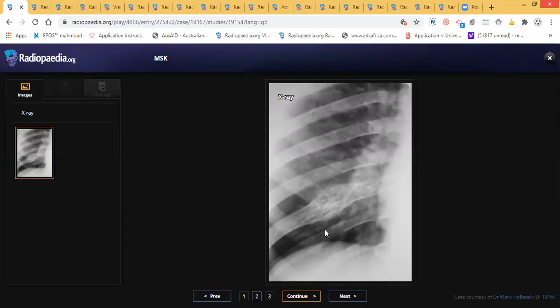Again, if you shift to this case, you will mention what we mentioned now. It could be fibrous dysplasia if it is a bony lesion, right? So you will consider it as a bony lesion in the rib. So you'll mention fibrous dysplasia, but what else? It could be metastasis, maybe, but not very typical. Maybe with this sun ray appearance a bit, so maybe it's not very benign. Maybe it's enchondroma, hemangioma, Ewing's, but also maybe plasmacytoma.